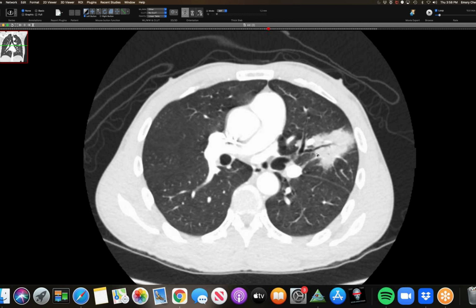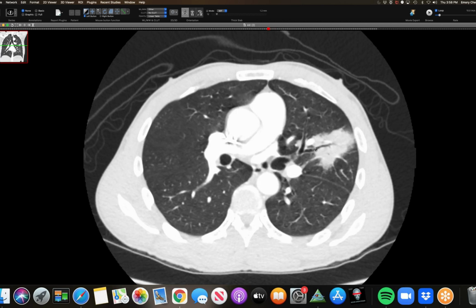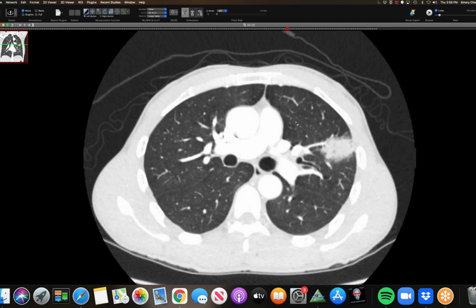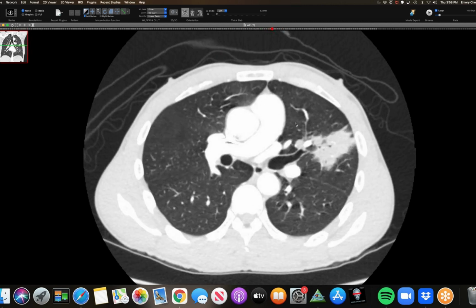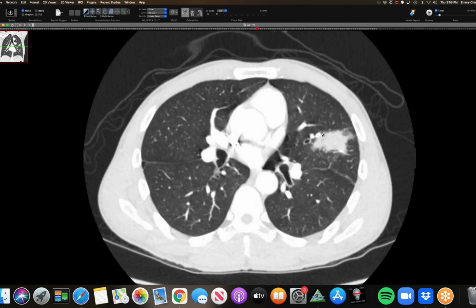It's kind of localized to this. It's very segmental. It's very much localized right around this airway here. It seems like this segment here is completely uninvolved. But I just found this interesting. They biopsied it and cultured it and grew blasto.